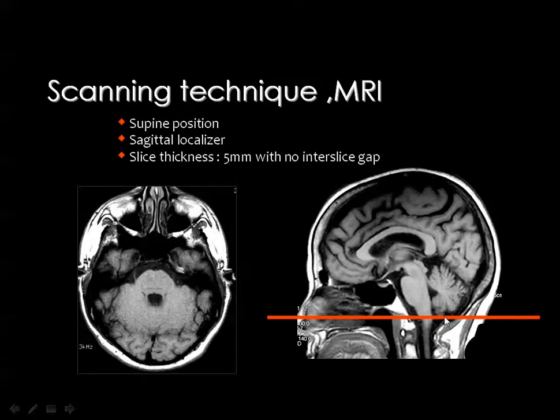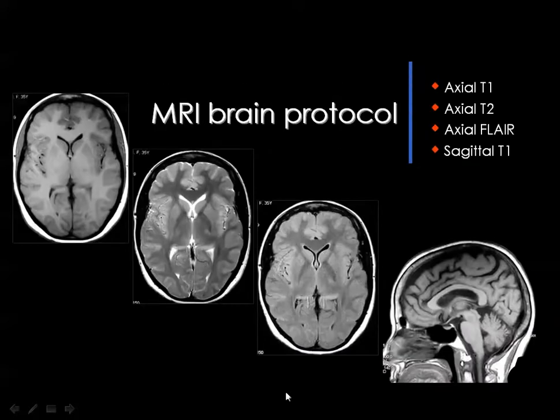Then starting by the region of the foramen magnum, proceeding upward, there should be some sections in the brain whenever you are cutting through the cerebellum, and then part of the occipital lobe will be behind the cerebellum, as you can see in this axial image. And this is the cerebellum, and look carefully posteriorly and you see the cortical sulci of the occipital lobes. This is not the case for the brain scans because we have an angle, and this angle usually does not allow cutting the cerebellum and the occipital lobe in the same plane.